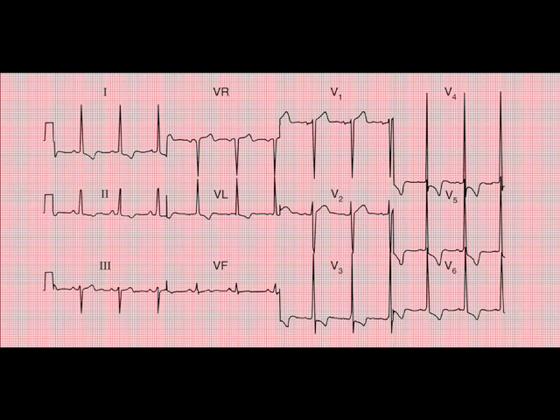Yeah, they're in sinus rhythm. Be confident there. Maybe that P wave's a little bifid, a little odd shape, but it's okay to me. It's rounded and it is just coming before the QRS complex. So we can measure the PR interval. We can see that it falls within 3 to 5 small squares or 3 small squares, 1 large square. There is 1 P wave per QRS complex, so that's good. We can then look at the QRS complex, beautifully sharp and narrow, very, very nice indeed.